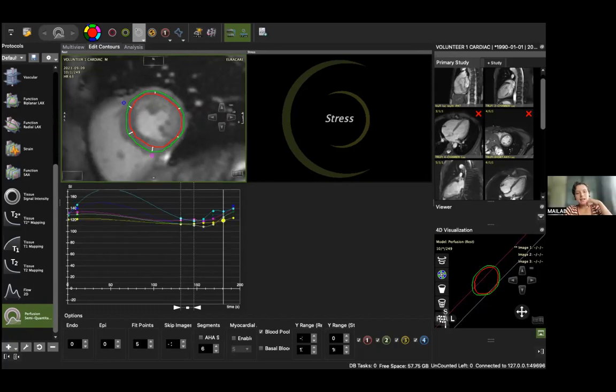And one question from my side. Do you compare it to maybe a normal value or something on the graph, or are they just showing the segments? I'm not sure whether there's a normal color code there that you use the segment to compare. Yeah, that's a good question. So I'm just going to reiterate again, this is a sort of new technique that we're developing. So here, this is the original method that we were using. This is not normalized to any kind of normal value. So this is literally just showing a change in signal intensity over time.